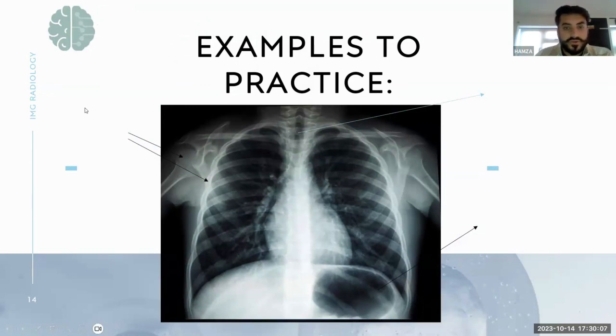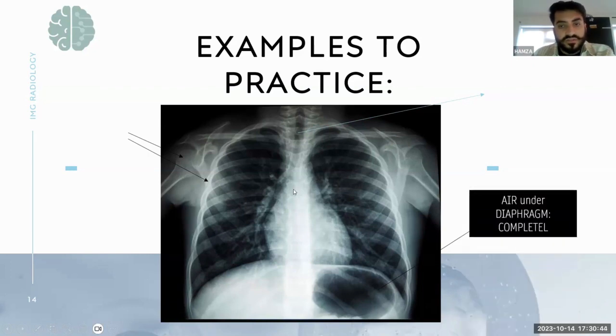What I'd like to do is point out a couple of particular structures that you can see on this picture. Does everybody have access to the chat at the bottom? I'm just going to message here saying chat, and if you can put a thumbs up for those people who have access to it. Yep, awesome. What I want you to do is type in your answers as we go through these things.